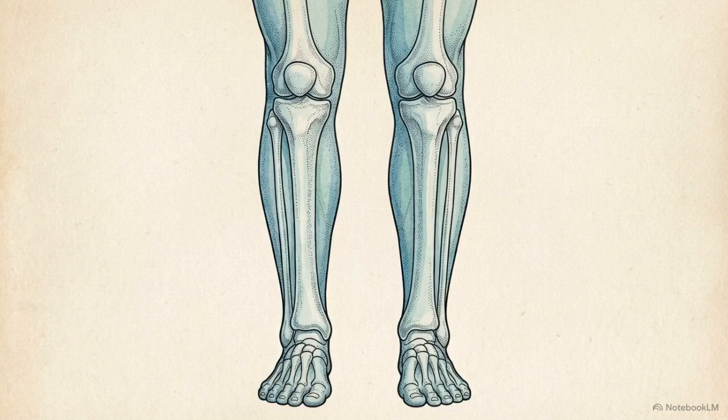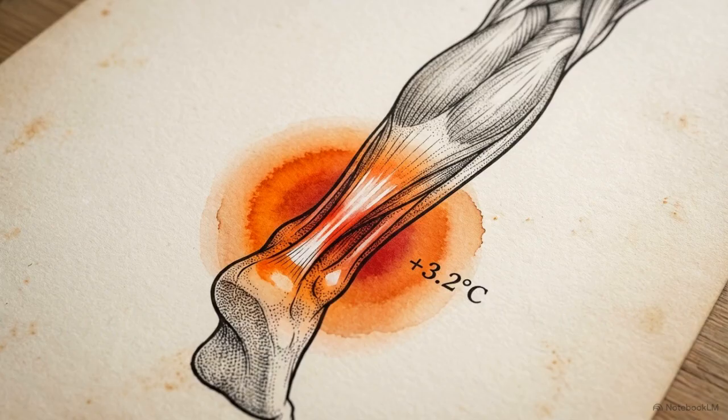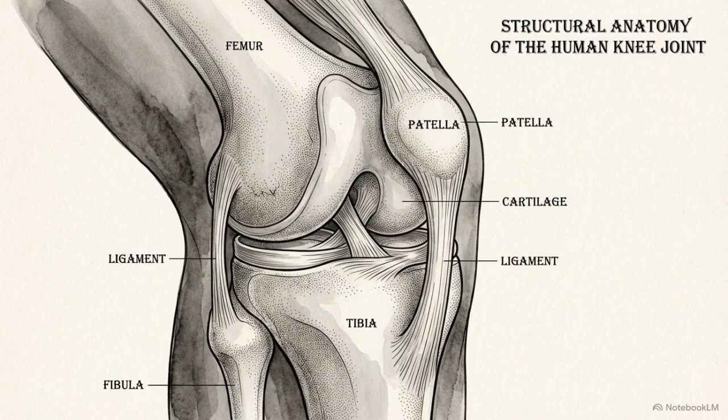This image shows a clinical thermogram of the lower extremities. On one side, we see uniform, cool colors. On the contralateral leg, there is a stark, localized high-temperature focal point near the heel, complete with a distinct numerical temperature delta.